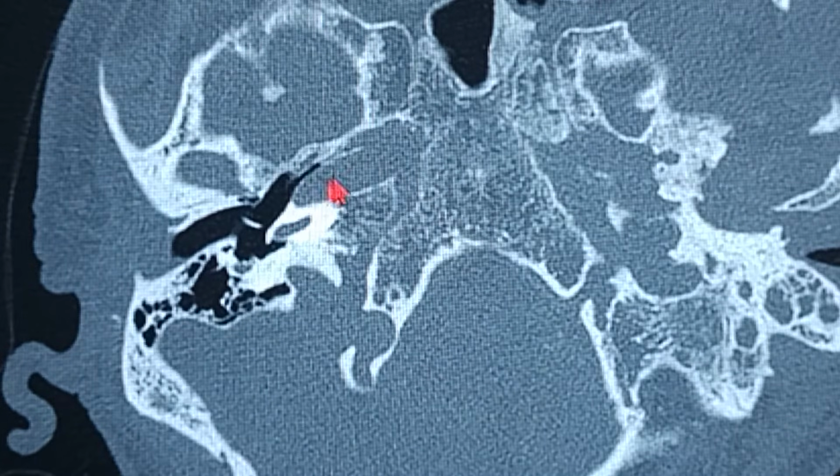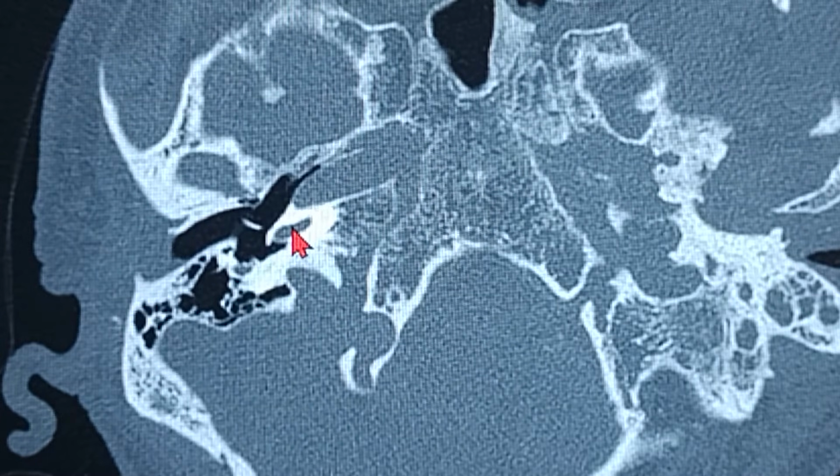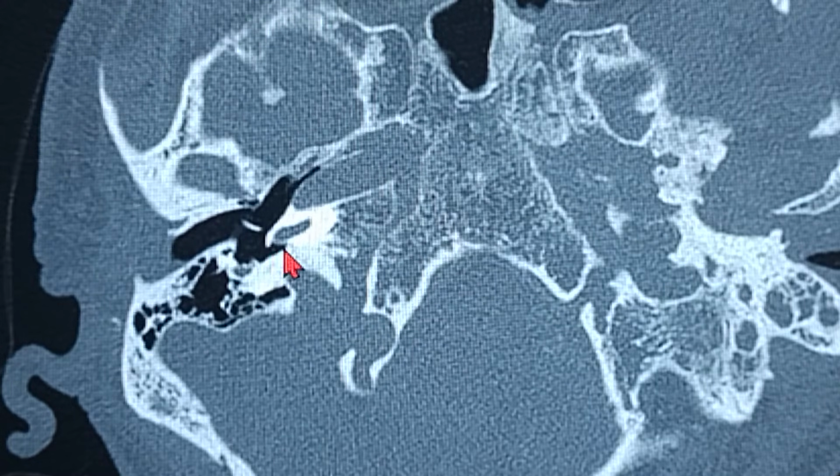So keeping the carotid artery as a landmark, just posterior to that, you can see a bone which is the promontory, the bulge of the basal turn of the cochlea in the middle ear. That's the cochlea which is starting, and that's the basal turn of the cochlea. So the first structure, keeping the ICA as a landmark, we saw that this is the basal turn of the cochlea. Okay, now keeping this basal turn of the cochlea as a landmark, what is this structure which you can see over here? Always remember the structure.